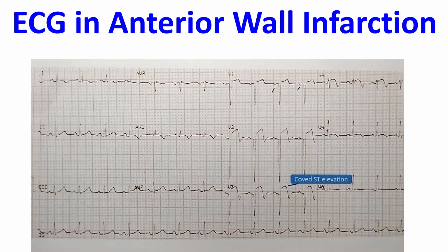We know that ECG is the best test for early diagnosis of acute myocardial infarction, even though there are other confirmatory tests, and also tests which can be considered when the ECG is not diagnostic but clinical features are suggestive of acute myocardial infarction. There could also be situations like post-operative patients where there will be no symptoms. Myocardial infarction can be detected by just a routine ECG. So we will go into the details of findings in this ECG.